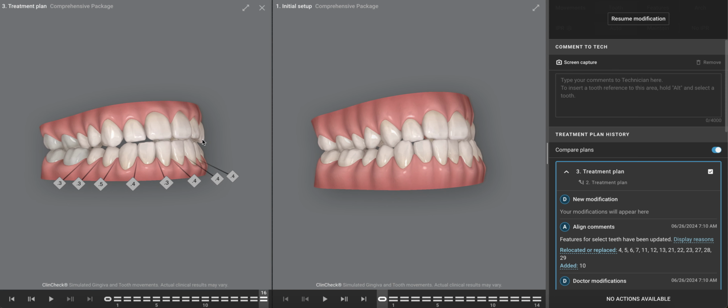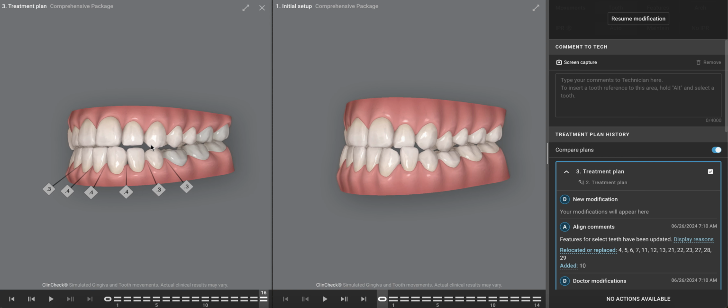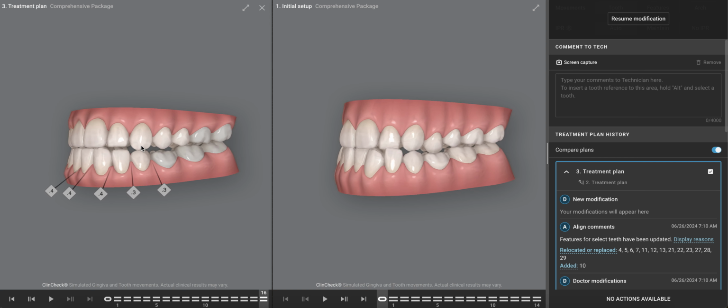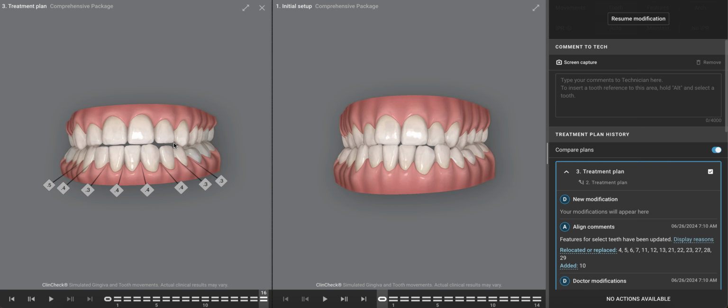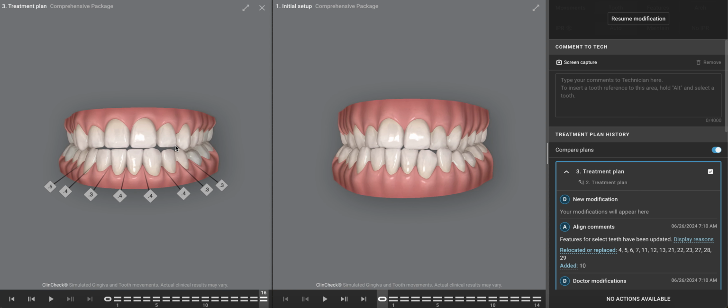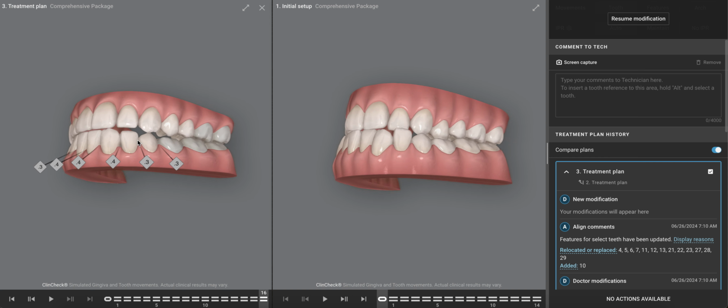So I would educate the patient that this is a case where you're likely to have several rounds of refinement trays to get this perfect. This is, again, a rather difficult case, but I think this would be a great place to start. Educate the patient on the IPR, potential enamelplasty after you're done to improve this anterior contact, flattening this canine, maybe making this lateral look like a canine, things like that.